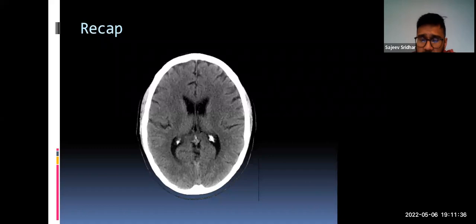The only difference here is that we are actually creating a three-dimensional image in a CT. That means X-rays are blasted through the body at all angles, so we're able to get a really good cross-sectional image of the different densities of the tissues within the body itself. The resolution of the CT scanner is focused on how well it's able to differentiate voxels. In a two-dimensional image, we think about pixels. Imagine a voxel as a three-dimensional pixel, that's it.